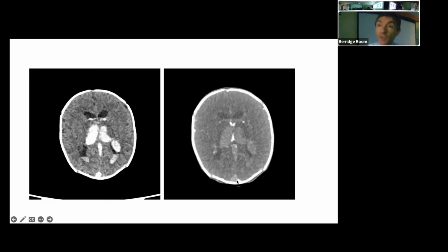And the sagittal sinus here, you can see most of it is showing this sort of intermediate gray, which we're interpreting as blood product, acute thrombosed vein, thrombosed blood. And there's a little channel of opacifying sagittal sinus adjacent to it.